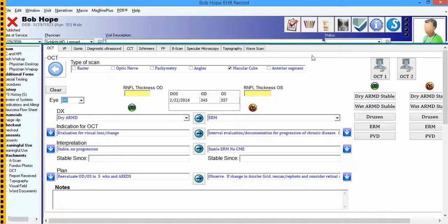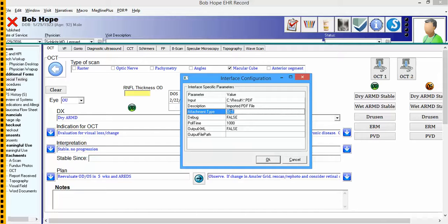If you are using an interface button, whenever it's configured by you or support, right-click, choose Interface, and Configure. If you have the attachment type set as one of your attachment types on the attachment filter, whenever you bring in those files, it will display a number adjacent to this label here on the left, and it will display the number to be a total number of files that you have just brought into this patient's record. So if there are 3 or 4 OCT files, you'll see that number displayed. By default, this is blank.